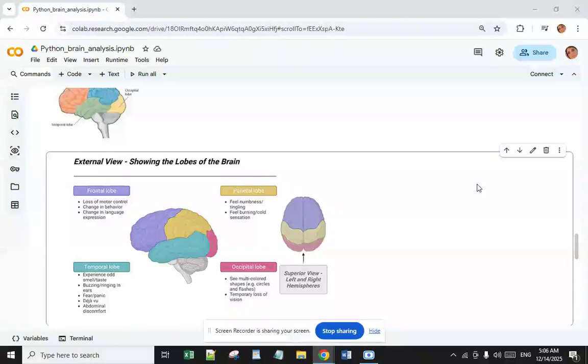And for glass brain plotting, explore how to retrieve data and plot whole brain cuts in glass model. And the next approach is computing a connectome with a sparse inverse covariance. Construct a functional connectome using this sparse inverse covariance and display the corresponding graph and matrix.